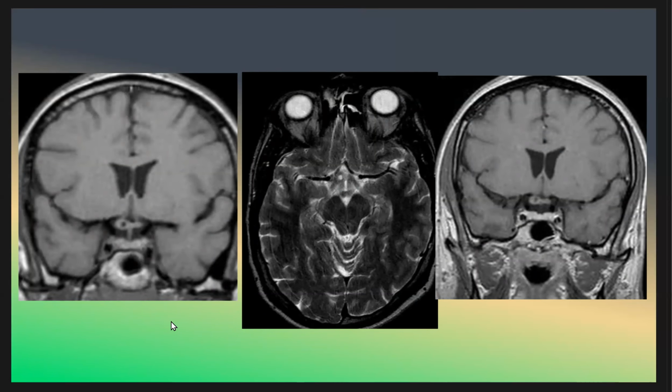What do you think the patient has? This is coronal T1, and this is enhancement, and this is T2. And we see a small cyst here on the right side of the optic chiasm. It is a small cyst, not enhancing, and it is a cyst of the optic chiasm. Okay, we move to the next case.